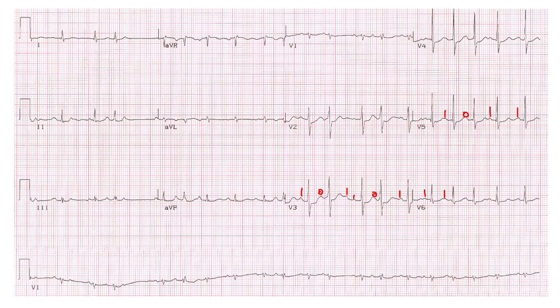The thing that I'm noticing about the P waves is that they have different morphologies. Not only are they occurring with a different PR interval occasionally, but they do have different morphologies. And so this looks like a multifocal atrial tachycardia to me. You have to have at least 3 different morphologies of P waves in order to call something MAT. But that would be my assessment for the rhythm on this EKG.